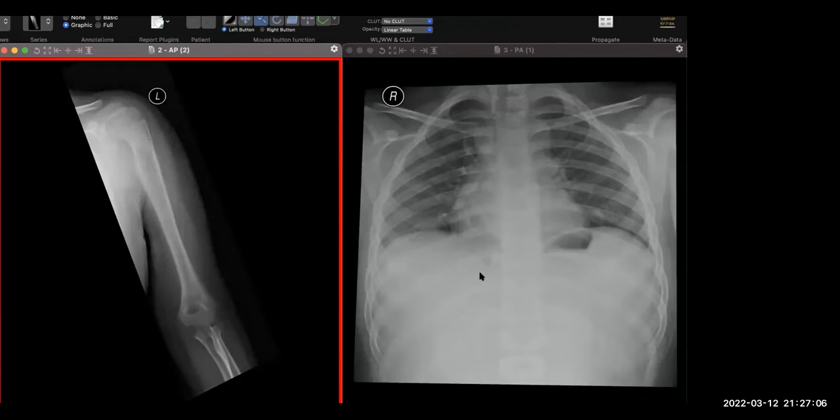So the correlative chest X-ray of the same patient, the lungs are symmetrical and I cannot appreciate any consolidation within them. I'm looking at the hila, which are symmetrical. There's mild widening of the superior mediastinum with the right paratracheal thickening as well. This may represent some mediastinal lymph nodes. Other than that, there are no nodules and there's no pneumothorax.